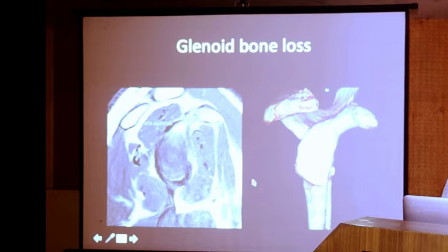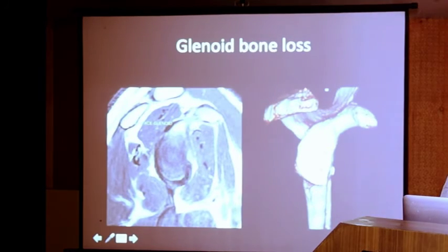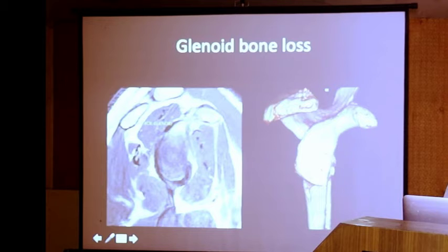Now this is a patient who had a glenoid bone loss. If you can see, even on an MRI, it is blunted. So there is blunting of the antero-inferior glenoid, which means that there is a glenoid bone loss. On a CT image, you can clearly appreciate that the roundness of the antero-inferior glenoid is no longer present. There is a proper discrete glenoid bone loss, and there is a small bony chunk present slightly more medially, which is nothing but the medialized osseous Bankart lesion.